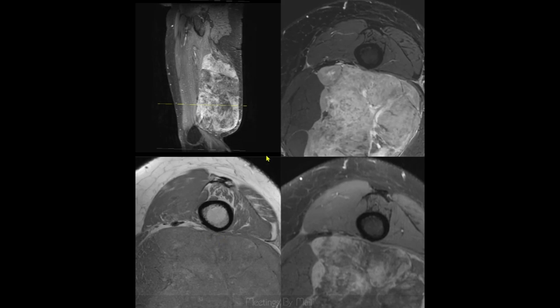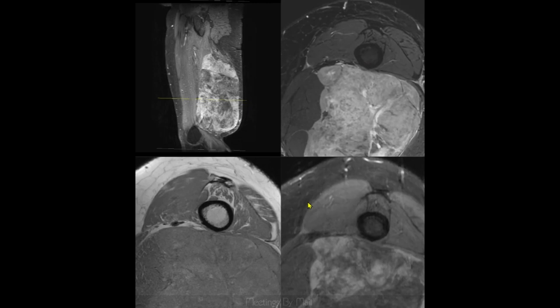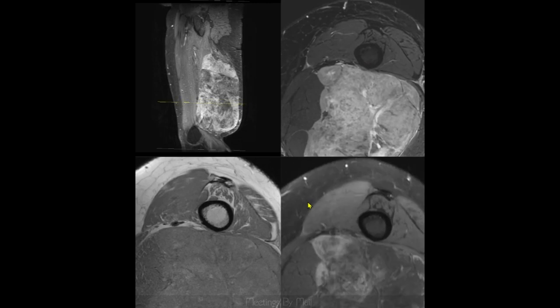However, I'll also mention that there's no edema in the cortex or the marrow. So there's no irregular cortical signal or marrow signal, and it's unlikely that that bone is invaded. What's more important is that it means they can strip that off of the bone without having to take the bone. And that could be important when it comes to stability for fracture risk. Sometimes radiographs are super helpful to see if there's some remodeling in that location, but this is very helpful to look for marrow signal abnormalities.